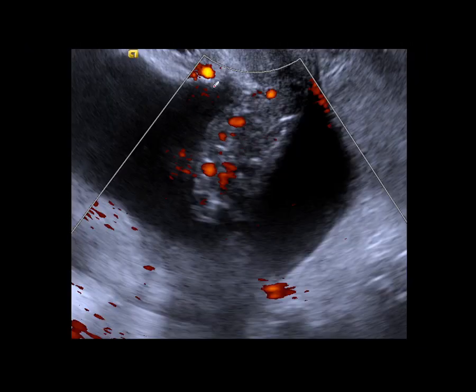But the person, you see, has the gain turned up very high. You can see this colour flow coming in from everywhere here. We shouldn't really be seeing colour here or here, and they called this a malignant ovarian tumour because they had the gain turned up excessively, I would think. Of course I wasn't there, I'm only able to go on their pictures, but it is producing colour flow out here in the middle of the fluid, which we shouldn't really have, and there's a spot of colour here and a spot here. So I don't really believe this is genuine malignant flow, and it doesn't show a branching pattern either.